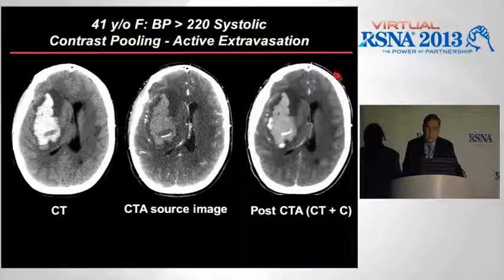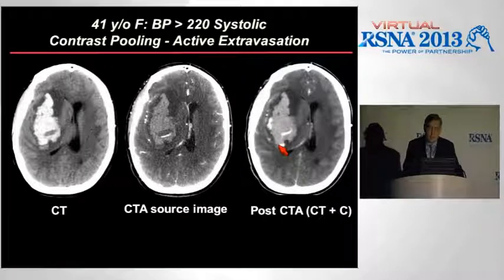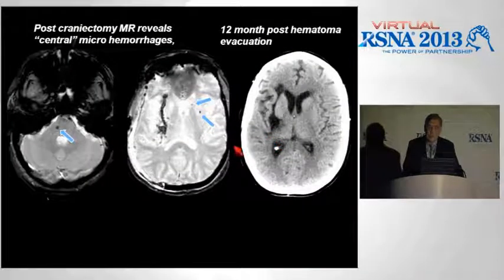This is a very important feature too, and one that really needs to be in your consideration. That is to obtain a delayed post-contrast scan after the CTA, which in this case shows very nicely that there's active extravasation at other locations and contrast pooling related to the extravasation. This patient went on to emergency decompression of the hematoma. You can see some residual hemosiderin here along the cleft of the resected hematoma.